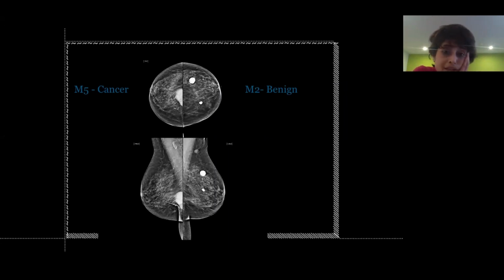And again, it brings to the fore the importance of including the inframammary fold, of pulling the pectoralis major muscle onto the mammographic plate. This could very well have not been seen on this image. Also, if you notice on the MLO view, the skin overlying it is attached to it, it's tethered to it, and there is some air within the skin fold, which tells you that the skin is at least tethered, if not involved at this point.